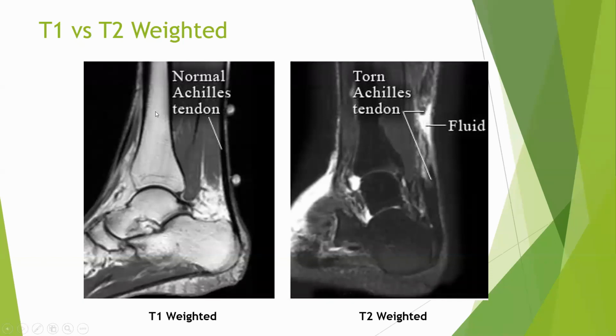Look at the fat just above the calcaneum, below the Achilles, or around the Achilles tendon, below the gastrosoleus muscle. Right over here, the fat layer is also very white. And you know very well that there is a bursa in there, right? Achilles bursitis, right? You know that. So the bursa has fluid, and the fluid over here and the fat over here will be white in color.